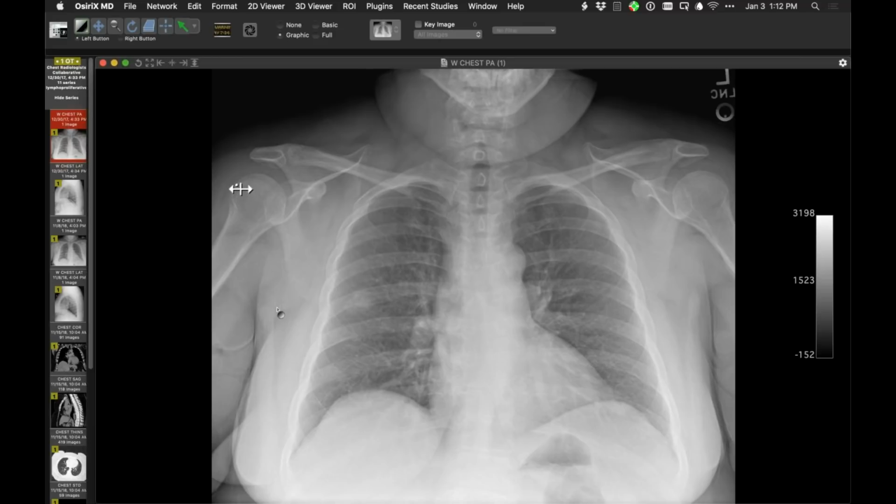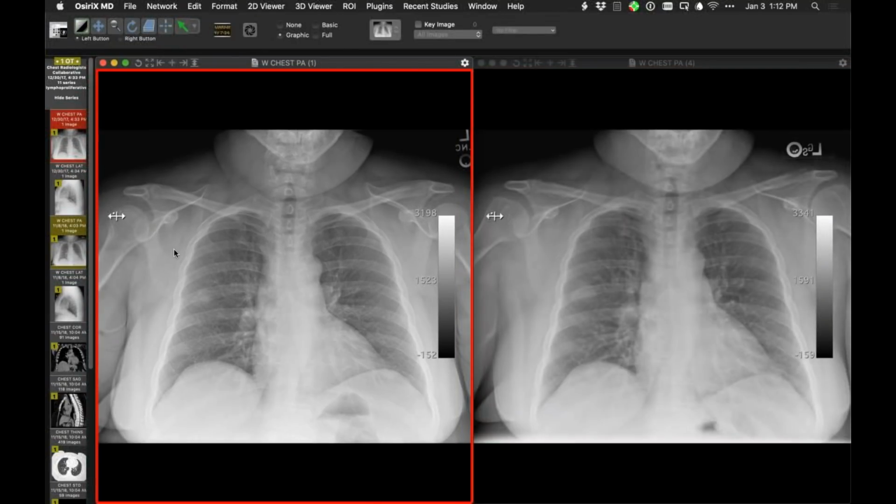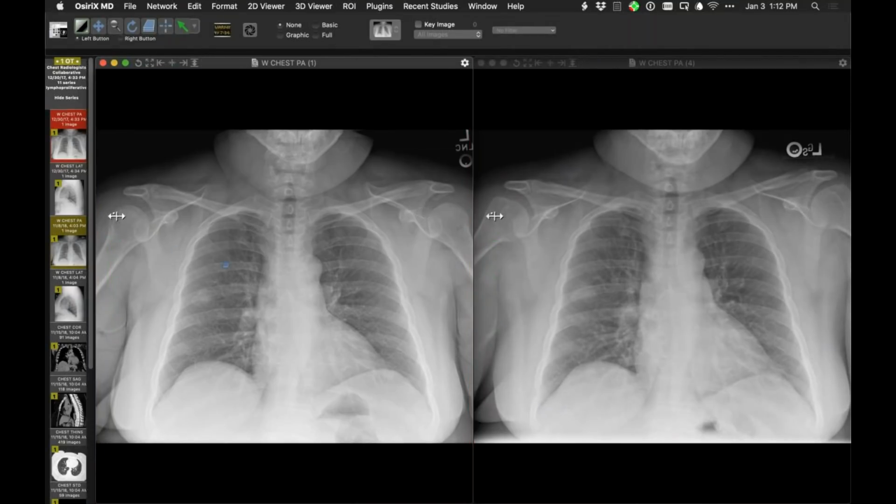described. That, by virtue of the patient's presentation, at least with respect to the recipient of the radiology report, was ascribed to pneumonia. The patient was treated for that. I don't know that any follow-up was done, but certainly in terms of imaging, no follow-up was done. And now we go forward in time to November of this year. And you can see that it is there. And it is a little larger in size.